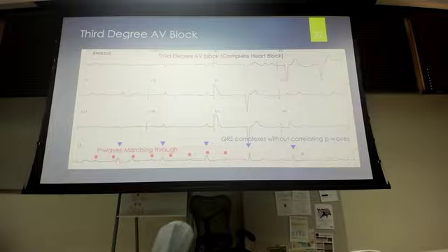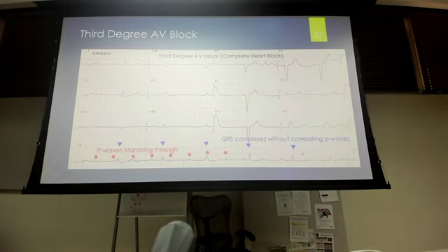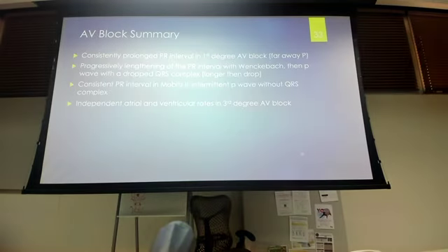But because we're not getting firing from above, the ventricles are firing at their own inherent rate, that 20 to 40. It's getting it by virtue of that overdrive suppression, where it's not getting impact from above, so it realizes it has to take over on its own.